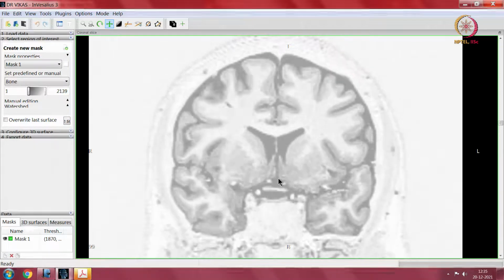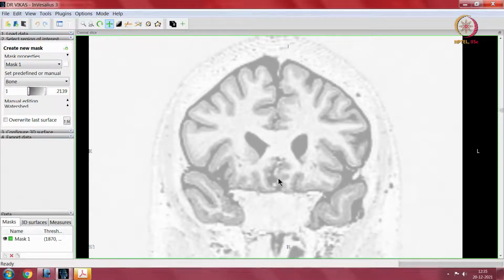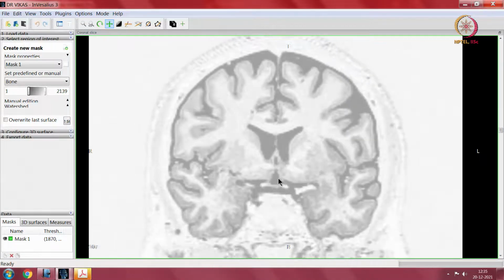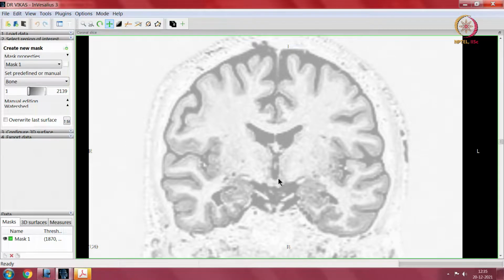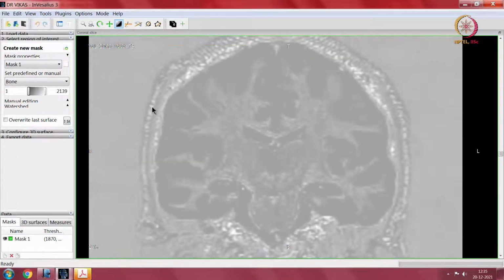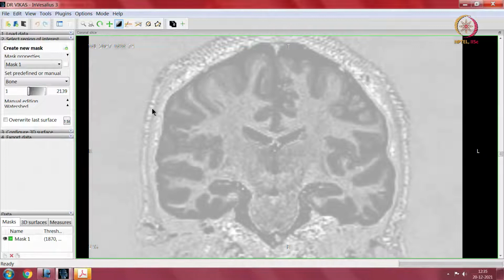Now, we spoke about thalamus in the axial section, let us try if we can get that in the coronal sections. So, we go back, change the window to appreciate the gray matter better. So, this is the brain stem, this would be the midbrain area, and then just above the midbrain area, this round structure over here is the thalamus.